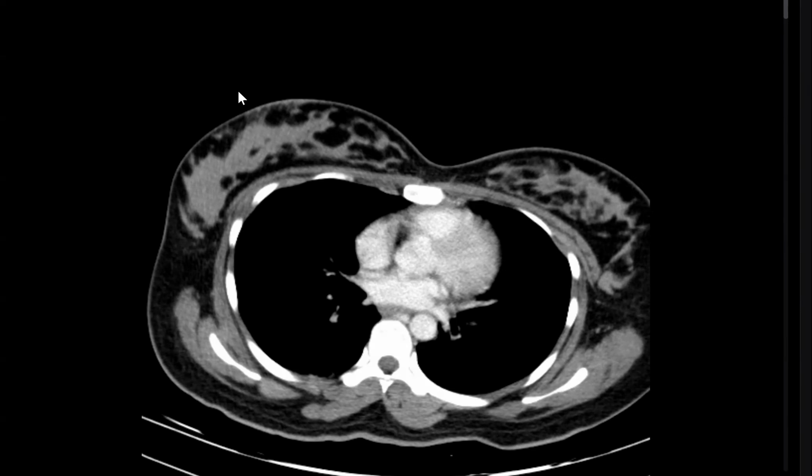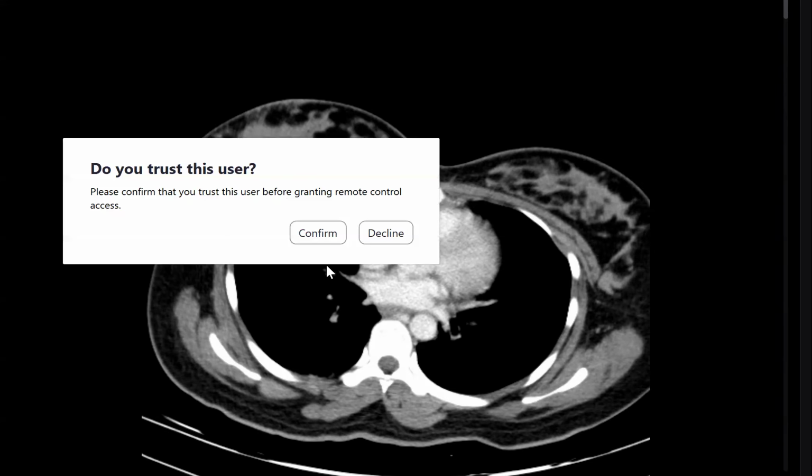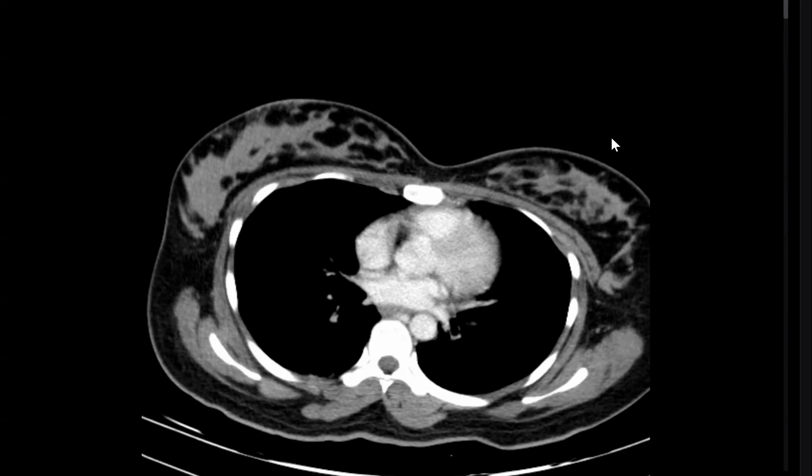Before we start the case, my friend, is this breast density normal or can you expect something? It seems to be increased in density, so maybe the patient is lactating, a mother. Excellent. Yes, this is a postpartum lady presented with abdominal swelling.